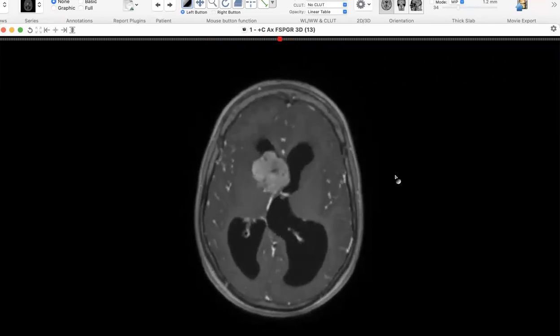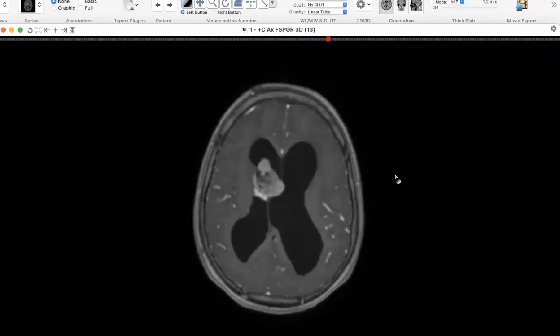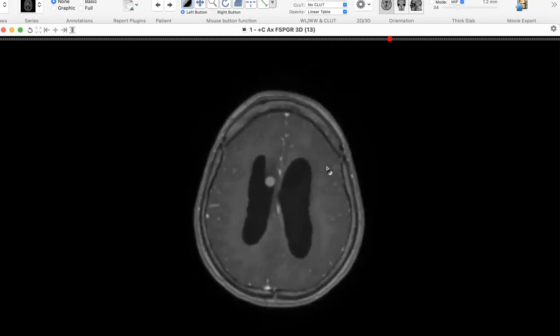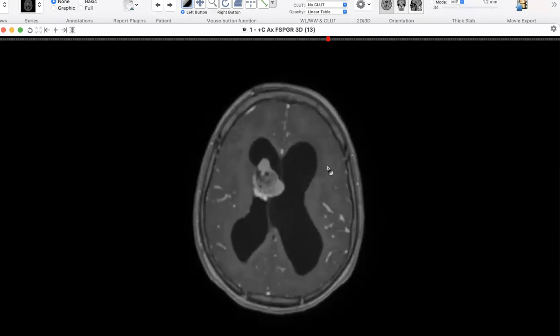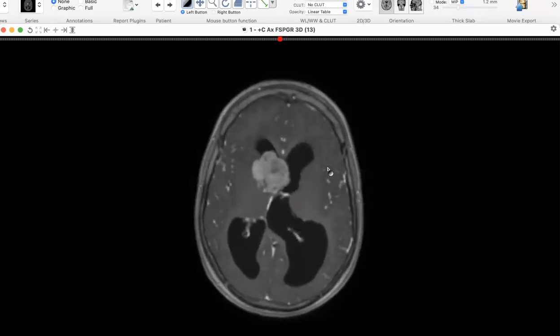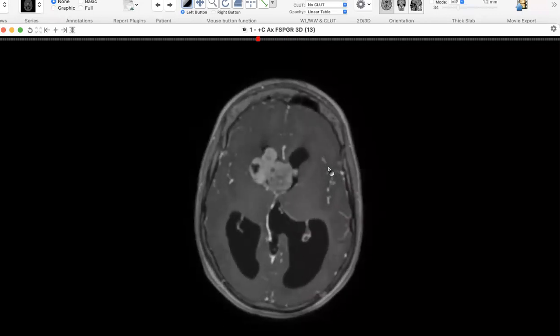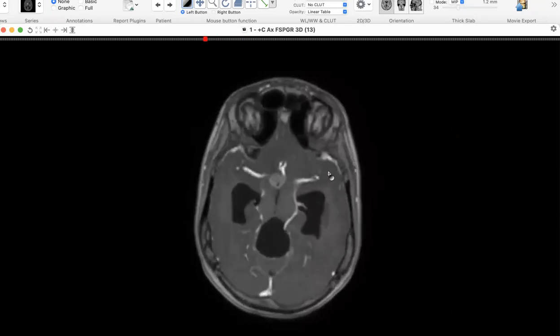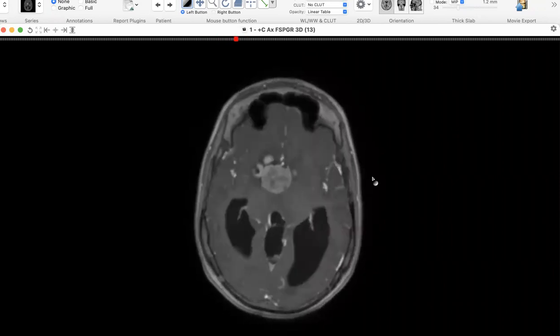Ependymoma is the second differential diagnosis. In the older age group, I want more central neurocytoma. How old should the patient be? Older age group. And the subependymoma also older age group. I'm not sure about the exact age, but this would be the differential diagnosis of the intraventricular masses.